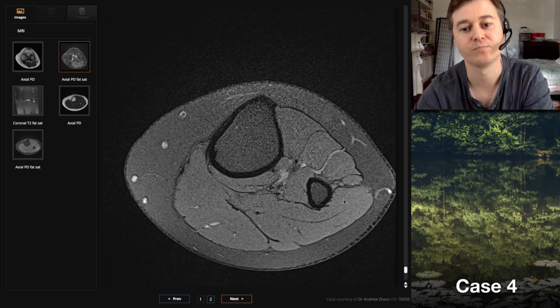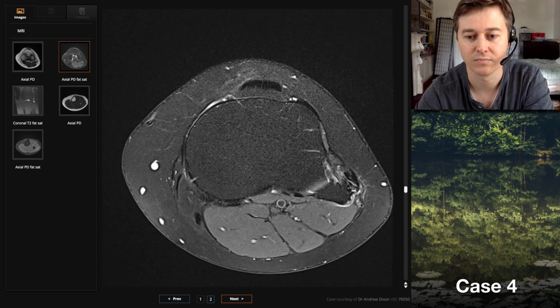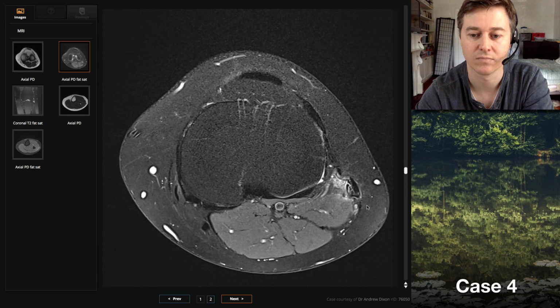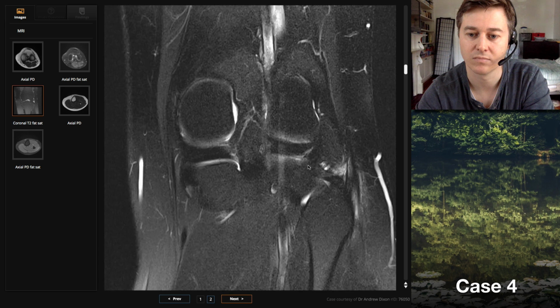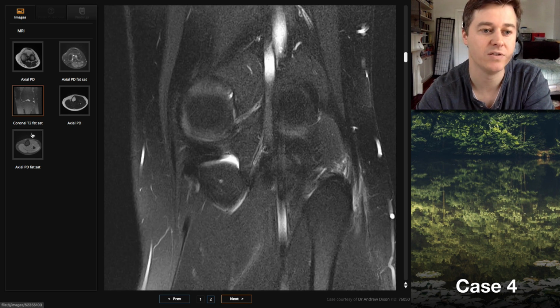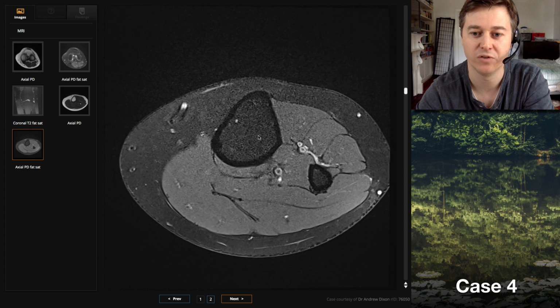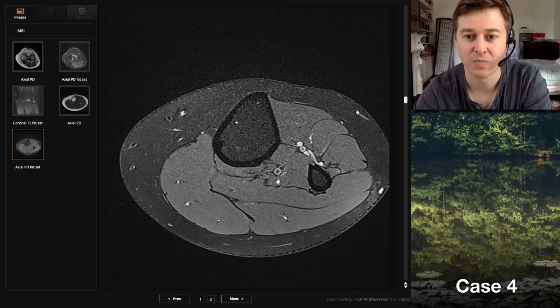This would be in keeping with a neuropraxia of the common peroneal nerve. Given that high signal around the biceps tendon, there might be a biceps tendinopathy as the cause, given that there's no lesion or evidence of impingement. Excellent. Good. And icing on the cake, what would you look for down on these slices down here in the setting of a foot drop?